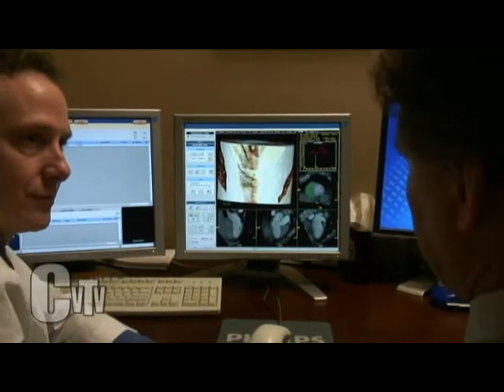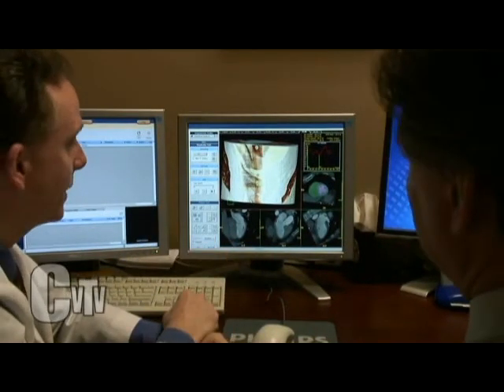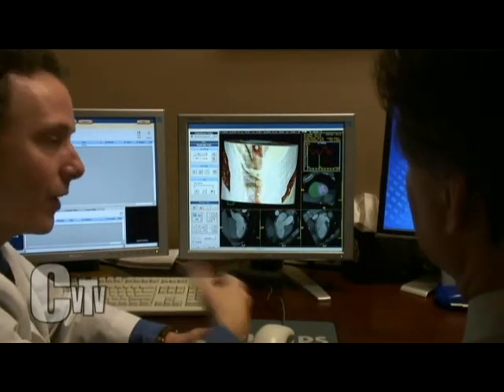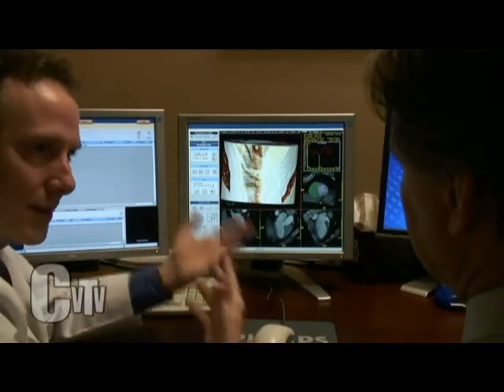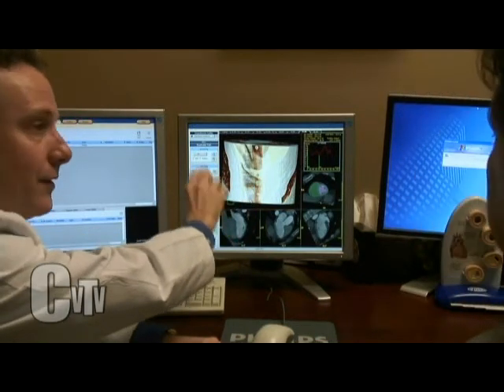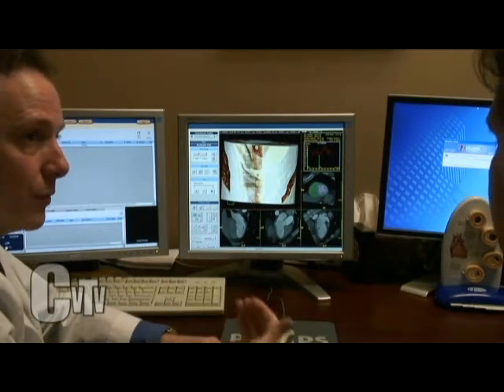because we can actually explore them three-dimensionally with this information. And as I tell you, half of this is useful information for me. Do you have aneurysms, pulmonary embolism, things that you probably couldn't even say or spell? And information for me to guide what's going on, what the problem is, and what we need to do to take care of it. But frankly, the other half of this tool is an amazing communication tool, where I could tell you about aneurysms, pulmonary embolisms, coronary artery disease, plaque, and you go, what is this, what's it mean? But when you actually are able to point it out, and I can say, there's a baby plaque, there's atherosclerosis, what do you want to do with it? It's an incredible tool for both communication and motivation and compliance.